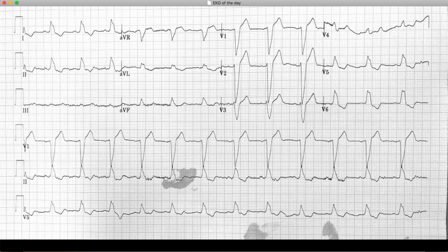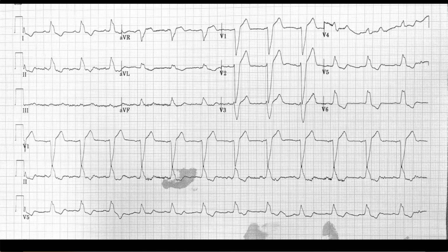It's a 10-second EKG, which they standardly are. Multiply the number that we have here, 13 times 6, since there are 6 ten-second blocks in a minute. That should give you a rate of about 78, which is pretty close to what the computer interprets this as as well. The other method works as well. Rate 78, so normal rate.